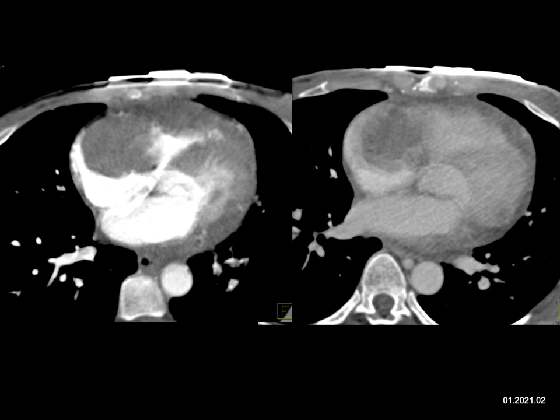Cardiac angiosarcoma is a probably good choice. It has that appearance, the location. It could be lymphoma. Lymphoma can involve cardiac chambers. It can extend into the pericardium. It could go beyond the heart and involve nodes or be in locations like the abdomen. Remember, cardiac lymphoma more common in HIV or immunosuppressed patients. So that's a possibility. Metastasis to the heart.